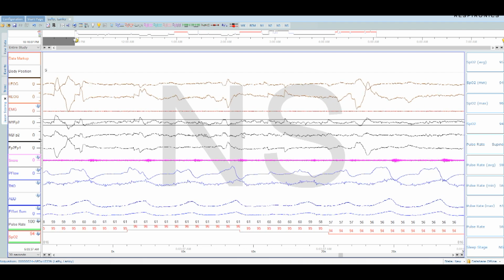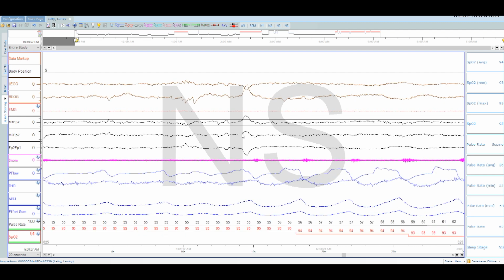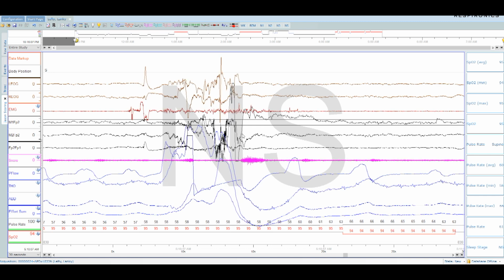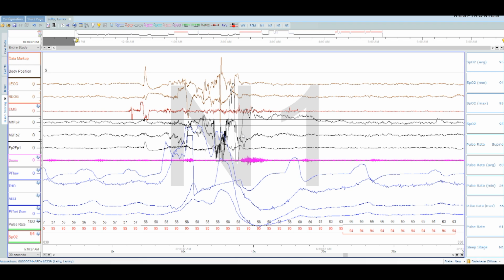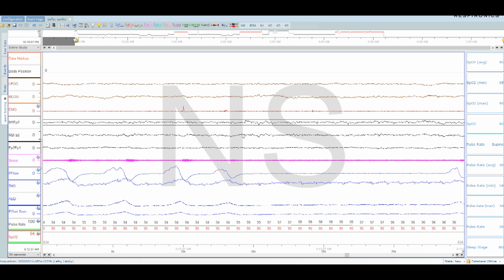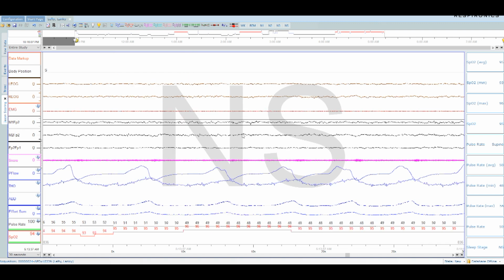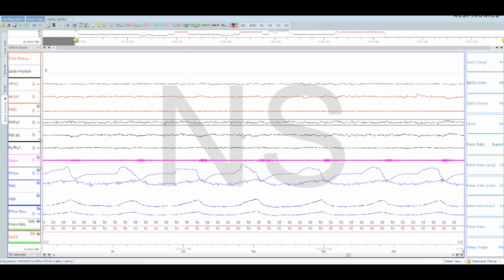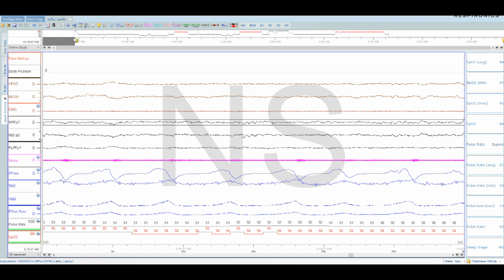But there's a specific look to a hypopnea in REM sleep, and the typical normal waxing and waning is not a hypopnea, unless you have a 30% decrease in airflow with a 4% or greater desaturation, or an arousal, depending on what scoring rule you're using. By the way, I'm using the 4% desaturation scoring rule for hypopneas on this. There are different criteria. That's just the one I use. Any lab I start up, that's what we use. I feel it is more all-encompassing of people's sleep.